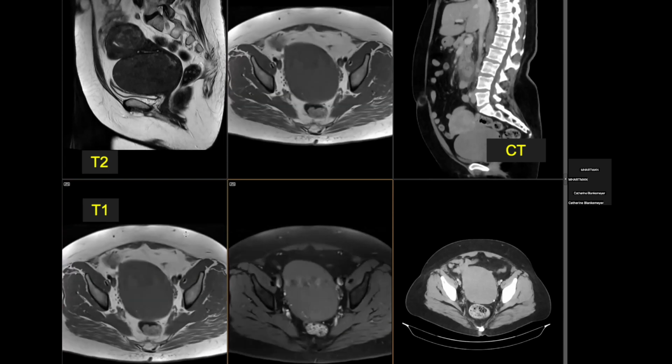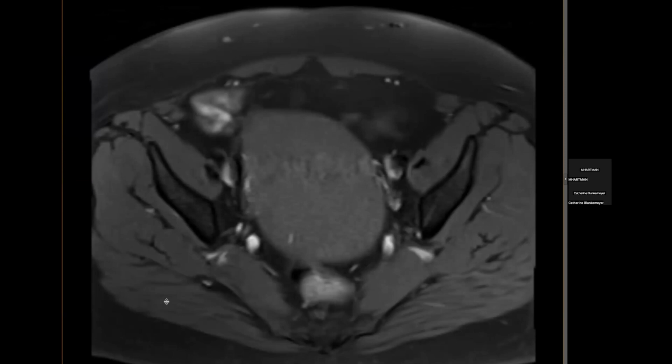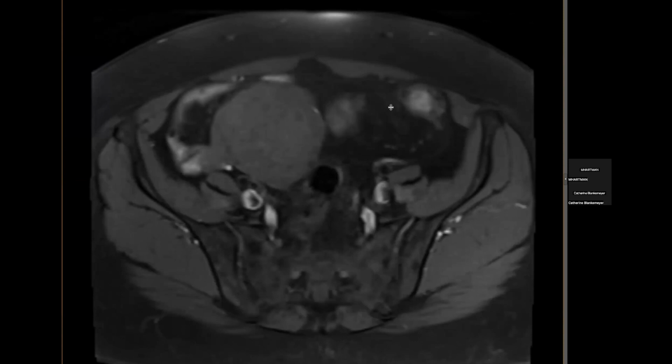And I'll say, let's focus on the subcutaneous fat. This patient got an instant liposuction. This is what we call fat saturation. All the macroscopic fat has been nullified. It's going to be dark. If only life were that easy to get a liposuction.